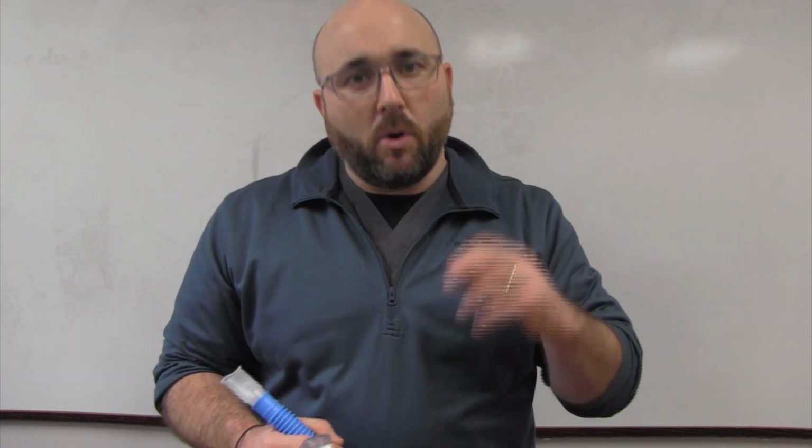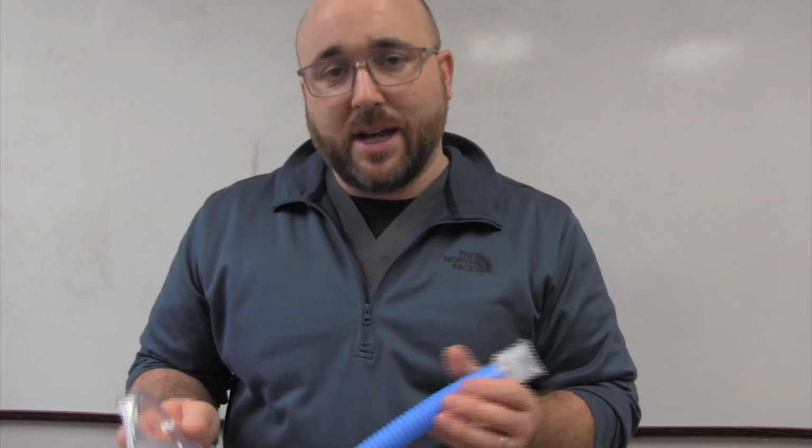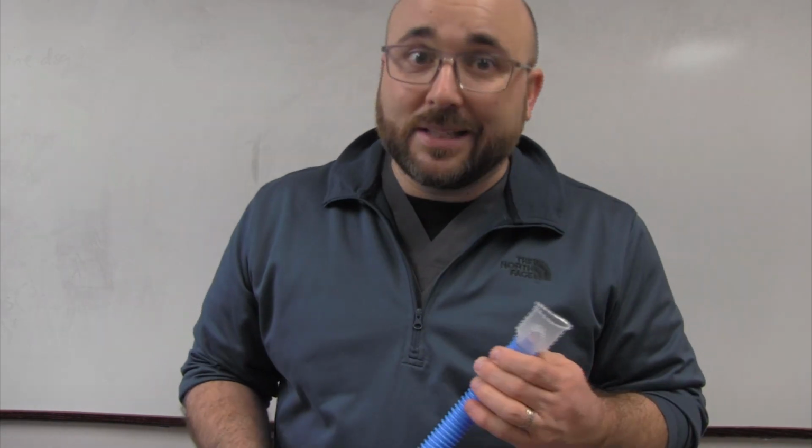So the most important thing about this is the breathing pattern. With patients, a lot of times if you hand it to a patient, they may blow into it. Well, that's wrong. This is all about taking air in, holding it, and releasing it slow. During that hold is where we're going to recruit alveoli, so it's really important. So if my goal is 2,500, the best way, and this is the down and dirty of it, is to have them take a deep breath in, hold it until the bell hits the bottom, then release it. 10 breaths per hour is really the best thing to do.